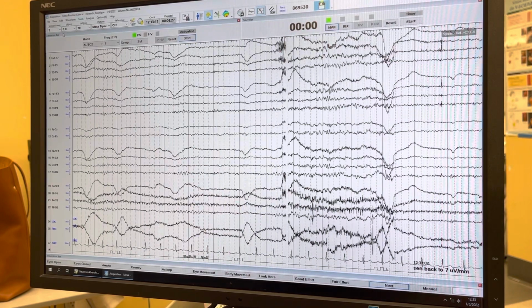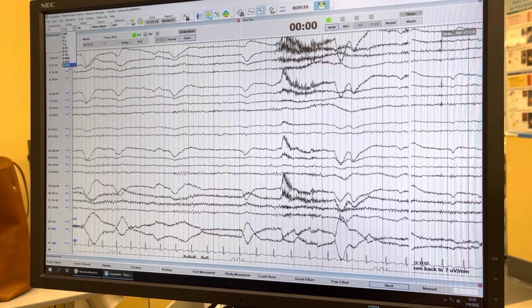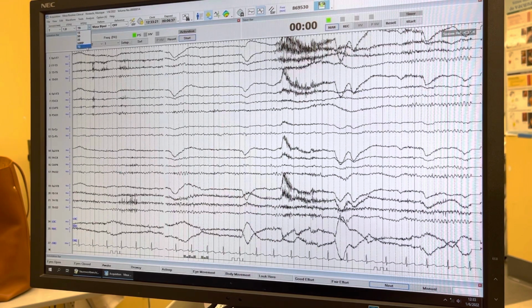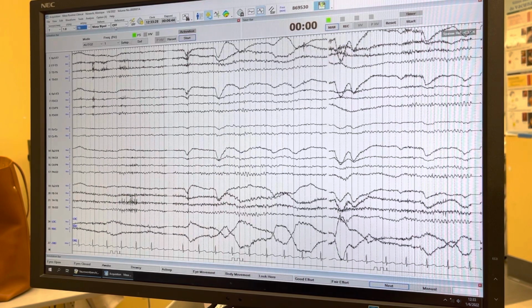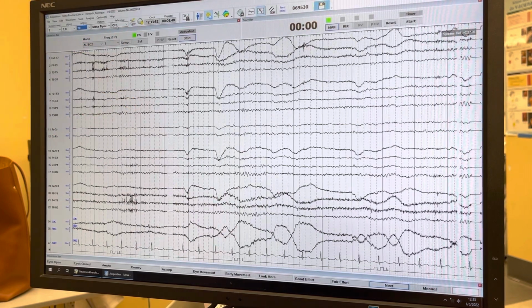And then this is the low frequency filter right here. See that? You can change it, go up or down. And here's the high frequency filter right here. And this is where it says pattern. Patterns means montages.